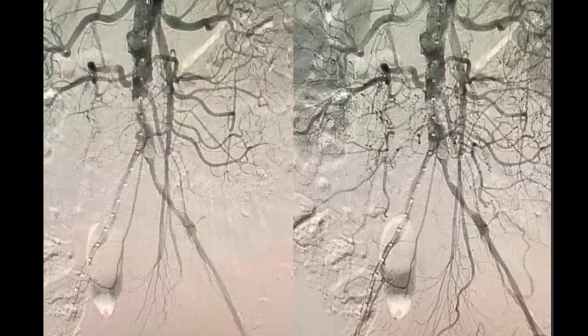So in summary, there is a mid or distal aortic syndrome. Let's not talk about syndrome. You said narrowing. I'm going to talk about this a little bit later. So there is diffuse distal aortic stenoses, occlusions, narrowing, whatever you call it, doesn't matter. So there is diffuse atherosclerotic disease of the distal aorta. You've given a beautiful description of the appearance here. The common iliac artery on the left side is involved, not really sure about the right side.